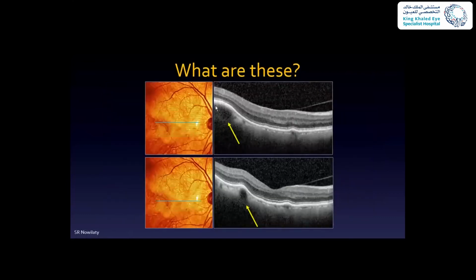And what are these here? What would this be? Okay, I'm waiting for your answers because this is fun. When you guys answer, I know that you're awake, and that you're trying to understand this. It's a choroidal vessel. Yeah, absolutely. This is a choroidal vessel.